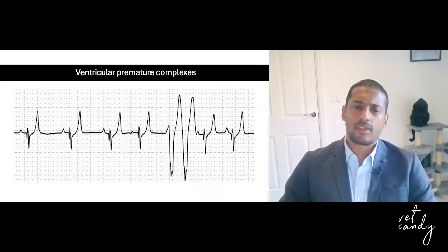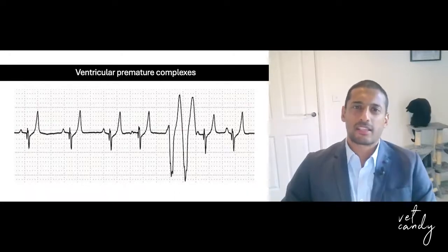You can usually hear VPCs on auscultation. A beat will come in earlier than expected, and there is often an associated pulse deficit, or at least weaker pulse quality. VPCs can occur singly or in isolated fashion. You can have 2 or 3 in a row, a couplet or a triplet. These VPCs don't typically need treatment. The approach is centered around determining the underlying cause.